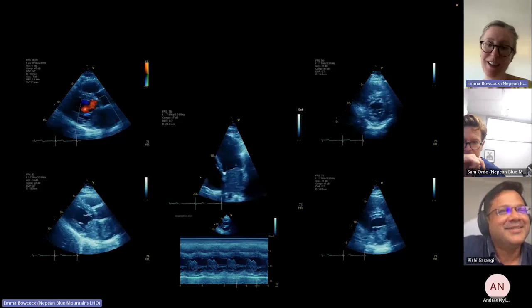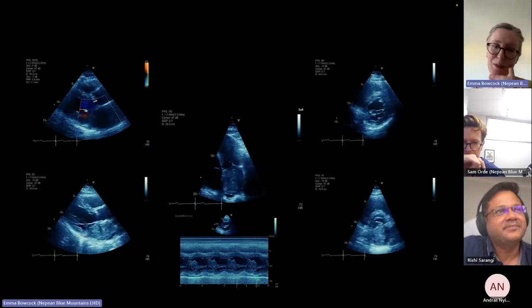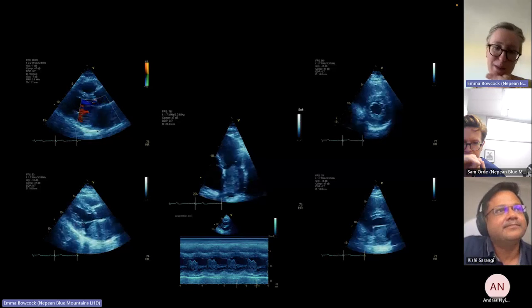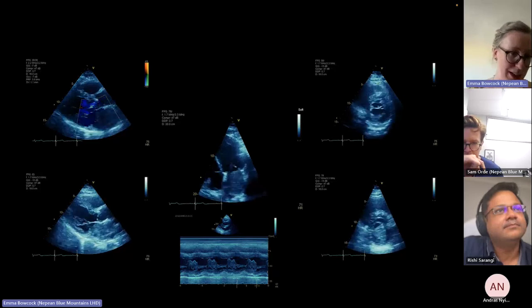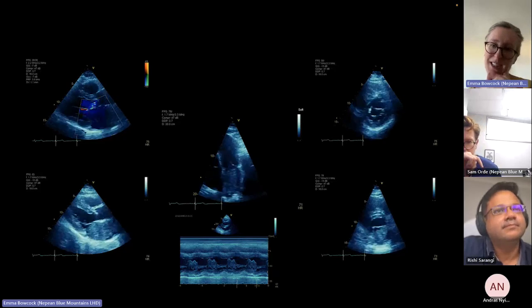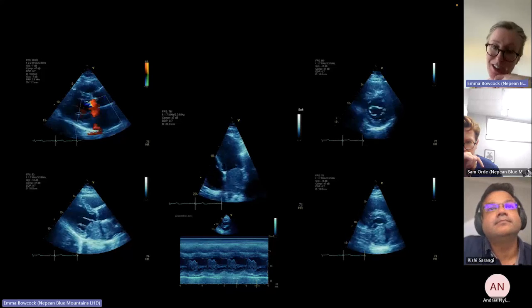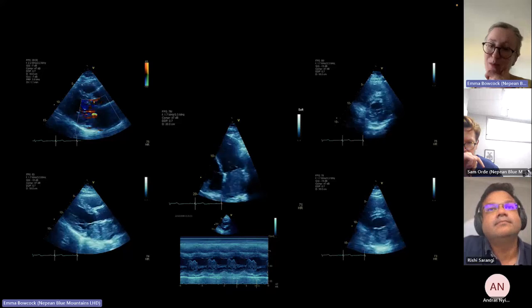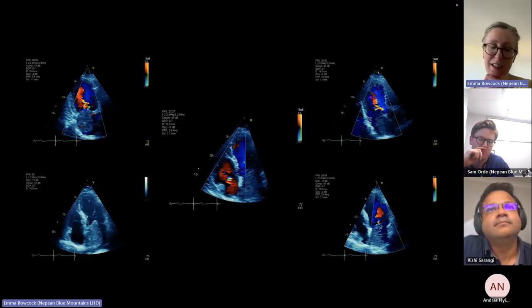Yeah, well, thrombus and other types of tumor would be differentials for this mass. Again, they could show you this in the DDU and ask for differentials of this mass and what you would like to see next and all of that. So you'd want to know whether there's obstruction of the mitral, whether this patient's also got functional mitral stenosis as well because of the myxoma.